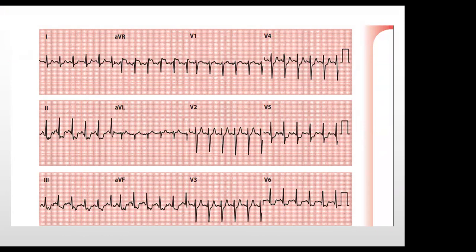So ST segment elevation in AVR is classic for left main disease. That has to be explained with a lot of electrical activity in terms of direction of impulses. Remember that AVR is the only lead that takes a negative deflection, in terms of the flow of electrical impulses relative to the leads.